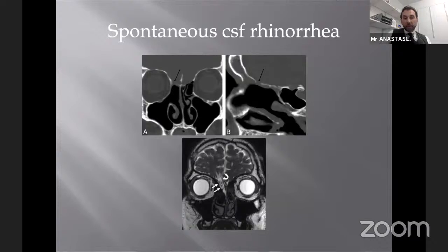Mr. Ram demonstrated very nicely on his MRI scans exactly the findings of idiopathic intracranial hypertension, which are the tortuous optic nerves because of the venous stasis in the ophthalmic veins, the intrasellar arachnoid herniation from the increased pressure, and the slit ventricles. So these are all pathognomonic of idiopathic intracranial hypertension.